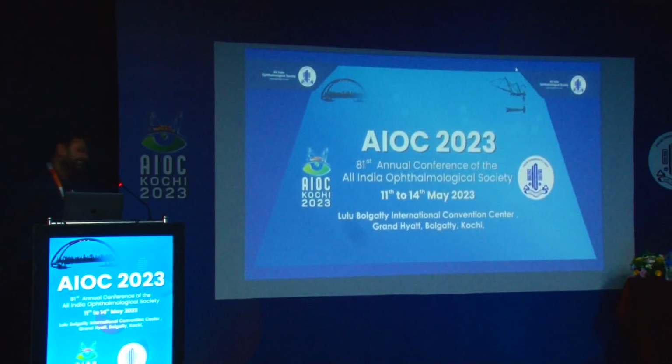Thank you, Mohit. Sorry, again overshot. I probably just would have one comment that a lot of the pictures that you showed looked very typical of a neovascular network in PCV and confluence of drusen in AMD. I think typically we reserve FIPED for the entity associated with CSCR when we see that little ripple and we're not sure if there is neovascularization or not. So maybe since this is acronyms, we would probably ignore the ones where you have these confluent drusen where everything is homogeneous, and at that point we are not really worried about whether it's neovascularization or not.